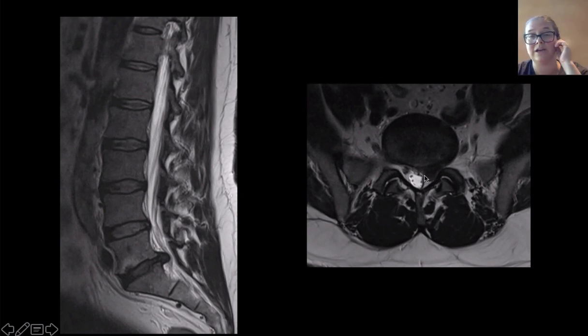I will tell you guys, I was looking through some of my MRI online talks, and Yusuf would have called this a protrusion. And when I look online at the lumbar spine nomenclature paper, and on Radiopaedia, they would call this an extrusion. So I'm going to apologize.